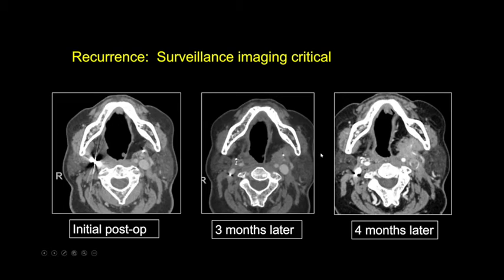And then 4 months after this scan, this has really, really progressed. Massive recurrence, nearly replacing the posterior portion of the fatty flap. Tumor now 180 degrees around the carotid. It's around the ECA branches, and look, there's thrombosis of the internal jugular vein. I would have called this negative here, tumor here, and then marked progression on that image.